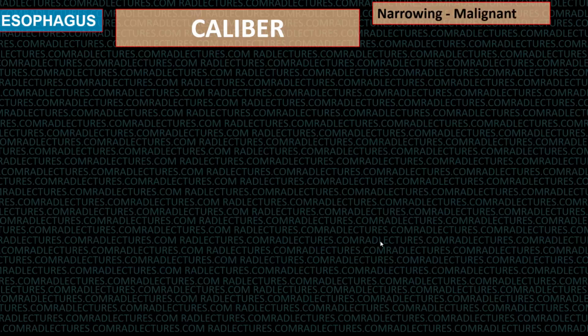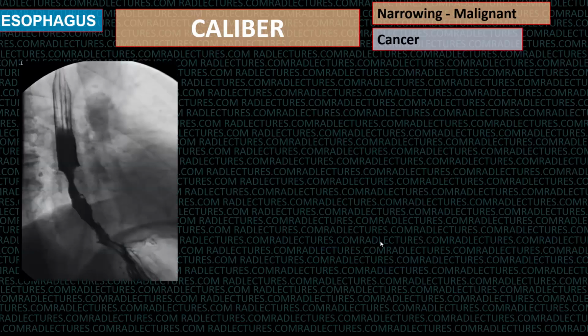Malignant strictures due to cancer are again typical. They can occur anywhere: upper esophagus, middle esophagus, lower esophagus. The important part is that there is shouldering. That is the most reliable sign. It is not a smooth tapering end. There is shouldering or an abrupt end. The esophagus is coming, it is fine, and then suddenly, bam, you get the stricture starting.